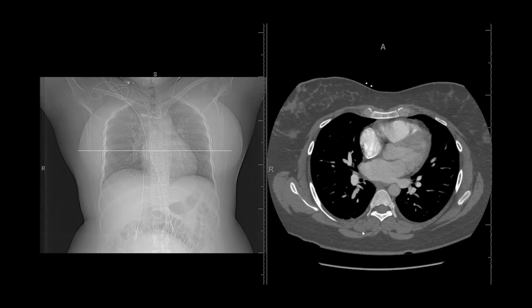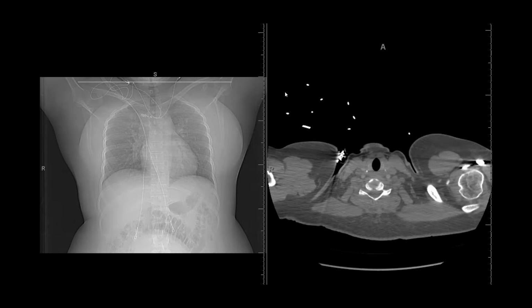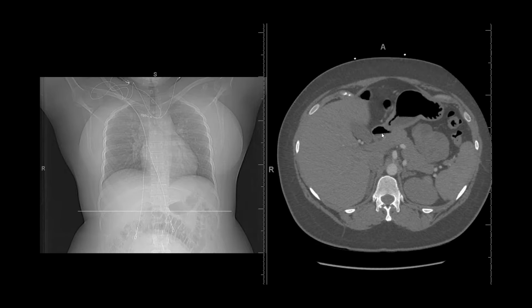So when you do a chest CT, the first choice is to decide what anatomy to cover. For this chest CT, you will see that the technologist scanned from above the lung apices to below the bottom of the lungs into the upper abdomen to make sure you cover all of the lungs. The second option is to choose whether you should have contrast or not.